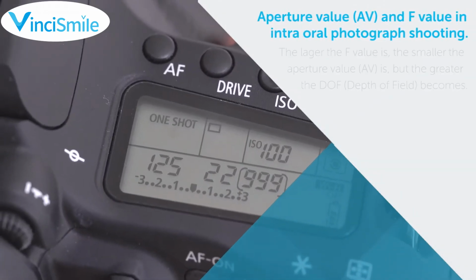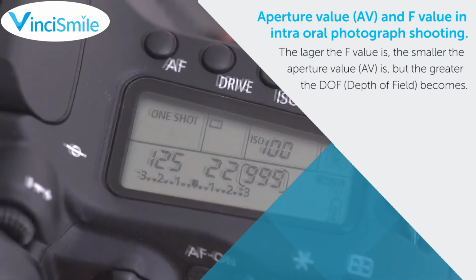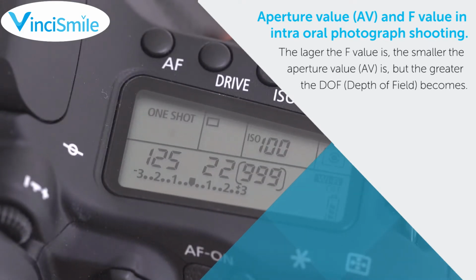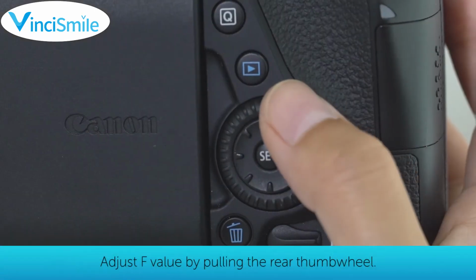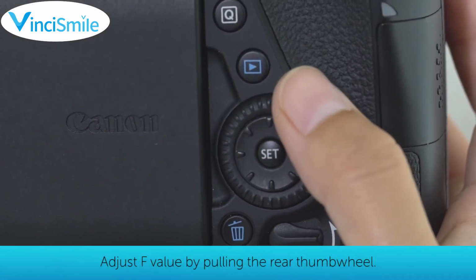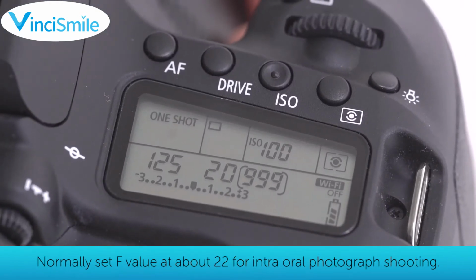Aperture value AV and F value in intraoral photograph shooting. The larger the F value is, the smaller the aperture value AV is, but the greater DOF, depth of field, becomes. Adjust F value by pulling the rear thumb wheel. Normally set F value at about 22 for intraoral photograph shooting.